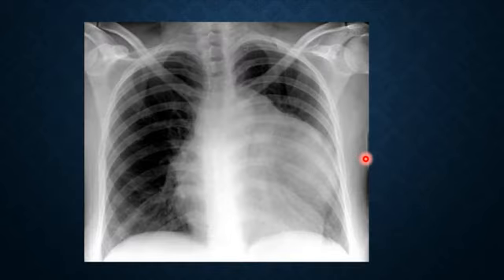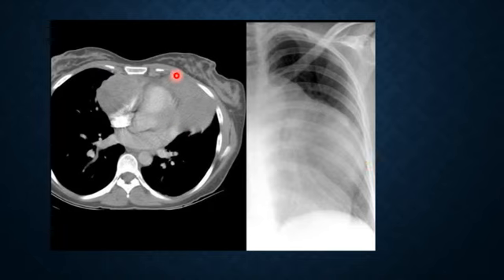What about this one? Within or outside? We cannot see any vessels, so it's within. When we did the CT scan, you can see this mass extending from the hilar region to the anterior part and even to the right side of the heart. Okay? It's a big mass.